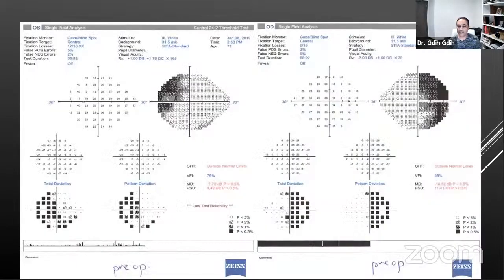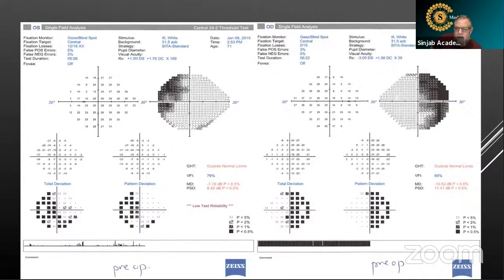Okay? So this is her visual field. I put them together, right and left, in the orientation that you need to see it. So first, what do you notice, Dr. Maza? I noticed that the right eye hemisphere is not passing to the other side. It is a hemifield, let's say. Yeah, so it's respecting the midline. Yes. I think this is something called junctional scotoma, related to the optic nerve tract.